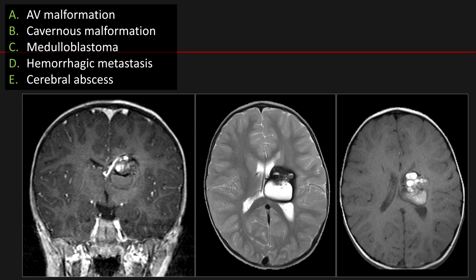Next case is seizure. Here, this is a classic picture for cavernous malformation, particularly on the T2-weighted sequence. You can see centrally it is lobular, multilobular, bright on T2-weighted sequence, and has a complete hemosiderin T2 hypointense rim. Because this contains blood product, there's variable signal within the central cavernous malformation, could be T1 bright, such as in this case.